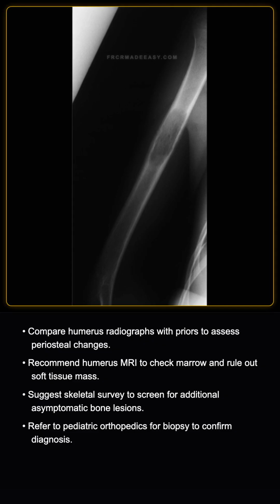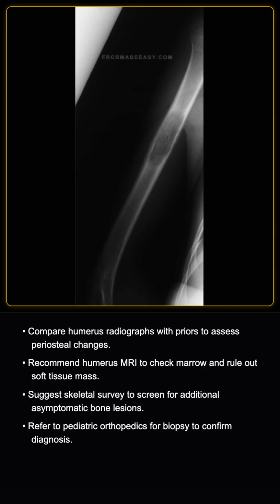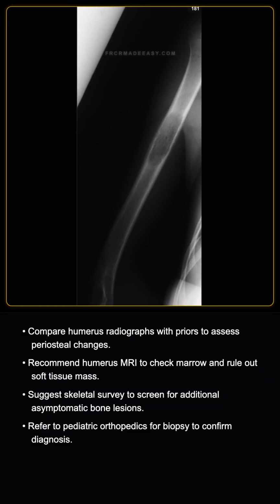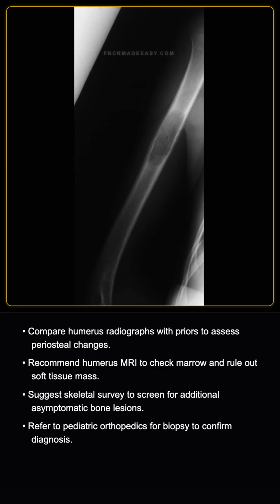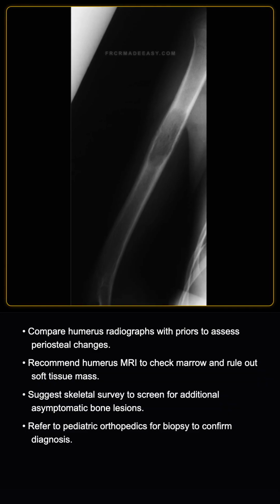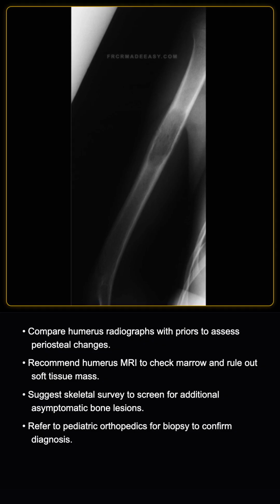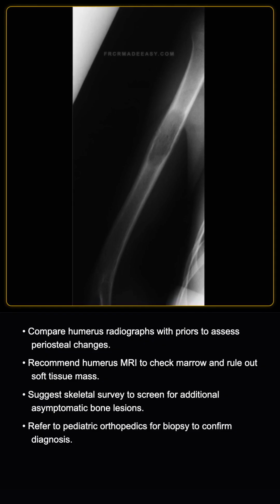Well, as a radiologist, I would recommend comparing these radiographs with prior arm films to evaluate for changes in the periosteal reaction. I would strongly recommend an MRI of the humerus to evaluate the extent of marrow edema, confirm cortical integrity, and rule out any associated soft tissue mass. I would suggest a low-dose skeletal survey or a skull radiograph to check for asymptomatic lesions elsewhere in the skeleton, which would confirm a multifocal presentation.